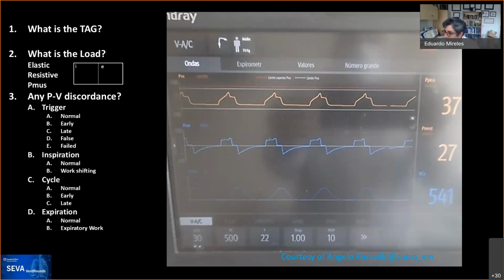Just give it a trial. This helps you read the waveforms in order, test your knowledge. Alrighty. 20 seconds.